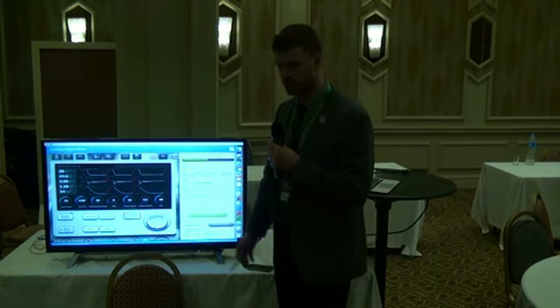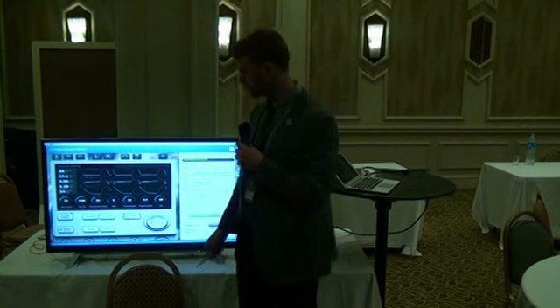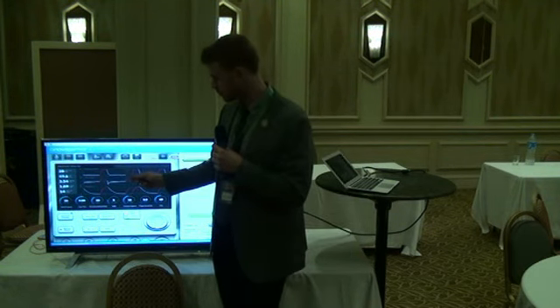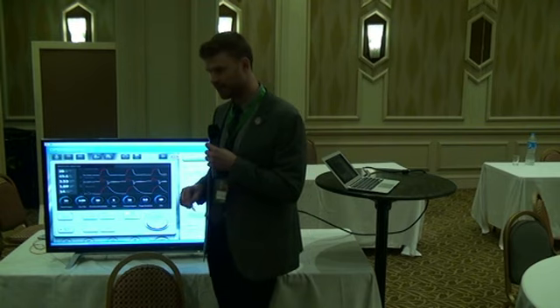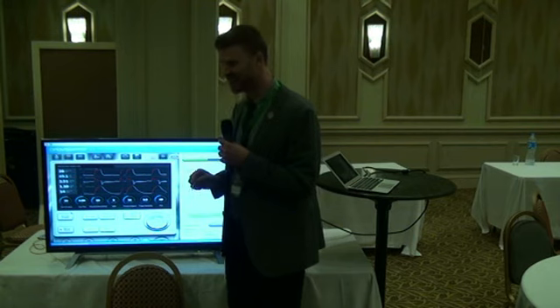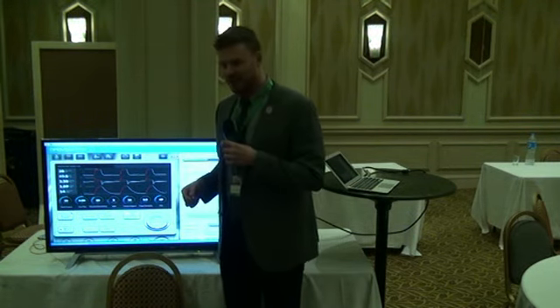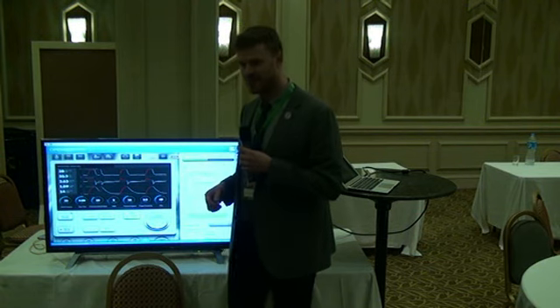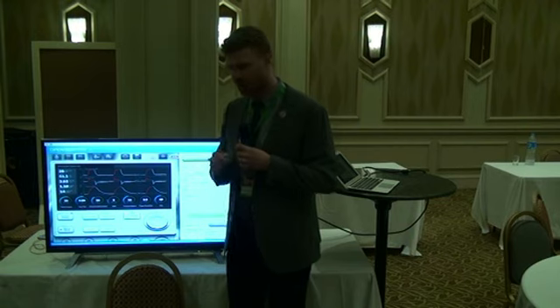Definitely a little bit deoxygenated, but yep, go ahead. Between the waves? Here? The expiratory time. Yeah, this is not normal. Good. Exactly, not normal for sure. Excellent. Air trapping, something. Yeah, I think you guys are on the right track.